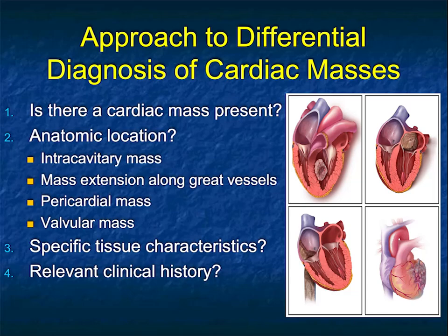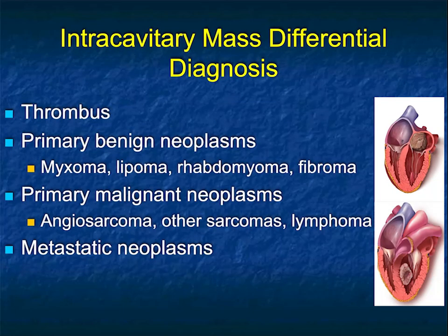Is it very vascular? And one might think of metastatic renal cell carcinoma or an angiosarcoma. Or does it have calcifications? What's its attenuation? Is it fat or not? And is there any relevant clinical history? And of course, that truly applies specifically when you might have metastatic disease.